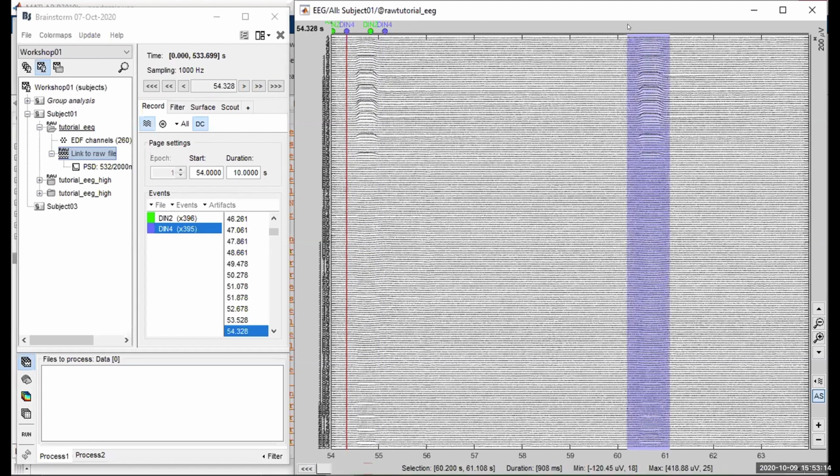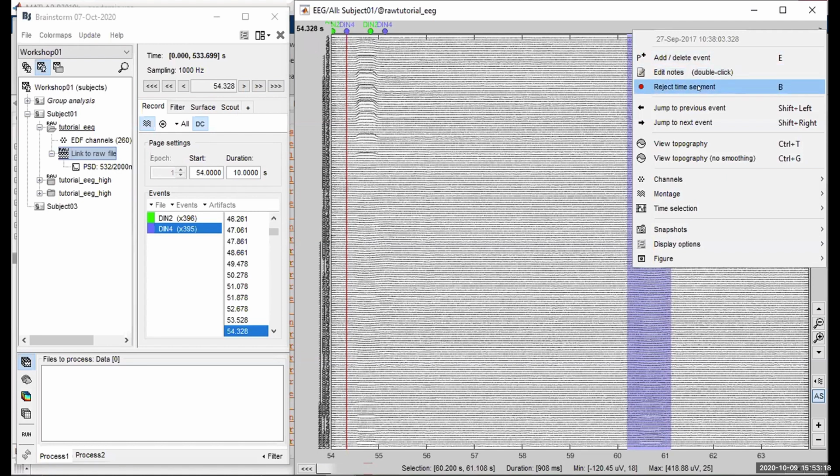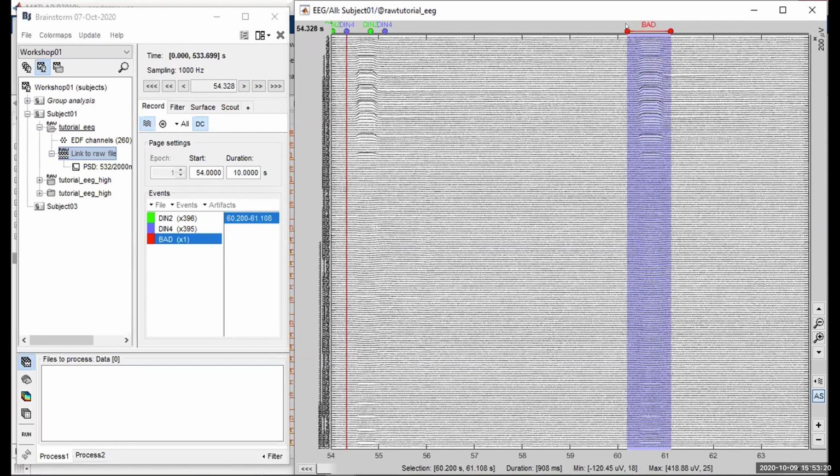All right, let's click here. And you can reject this time segment, for example, and notice that now there's a bad event that was created, and it's telling Brainstorm that in this specific time segment there was some sort of artifact, there was a problem with the recording here, so we want to skip this from our analysis.